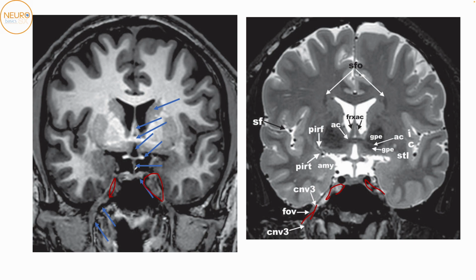Okay. Apart from that, this here is the infundibulum, going into forming the pituitary gland. This is the optic tracts on both sides. This is the hypothalamus, not the fornix. This here is the fornix, septum pellucidum, caudate, and putamen. This here would be the internal capsule anterior limb.